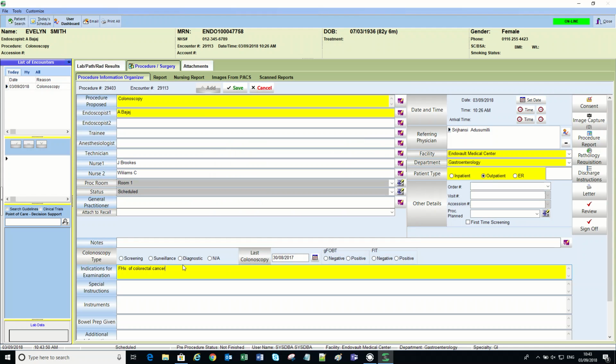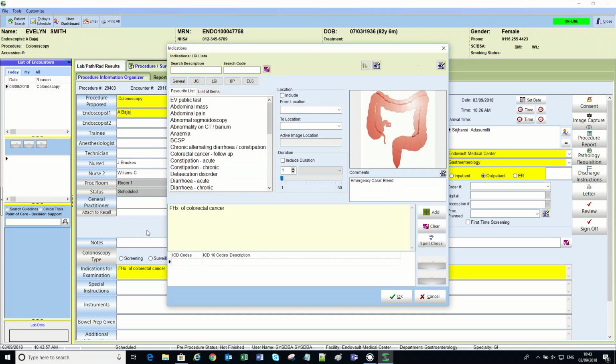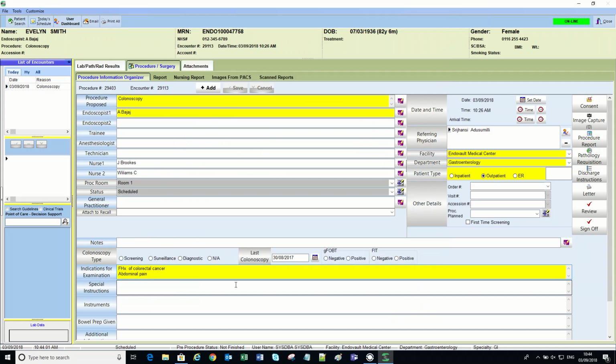Likewise, if you want to add any more indications, you can free text into this field, or the system comes with pick lists. So these pick lists are the NED pick lists, so we can just add a value. When you're going to start, you click on image capture.